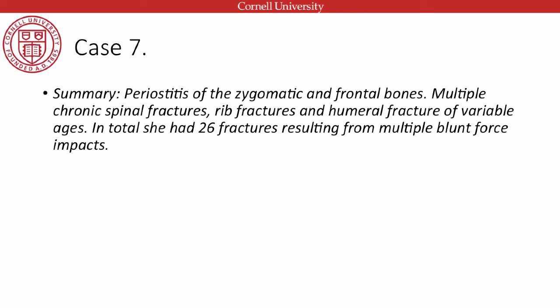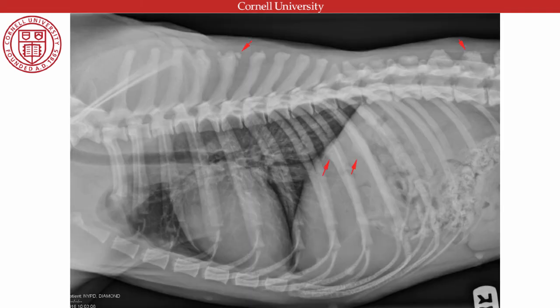Hi. Any sense of what sort of injuries cause dorsal spinous process fractures? Like how it's such a protected area. So it is. Remember, she's quite thin, so they're going to be sitting higher, and hers are sitting right at that margin where the shoulder blade protects these, and they're not there. So these are blows to the back, straight.